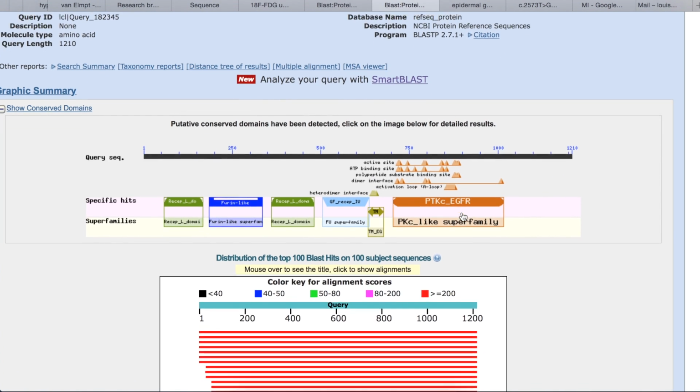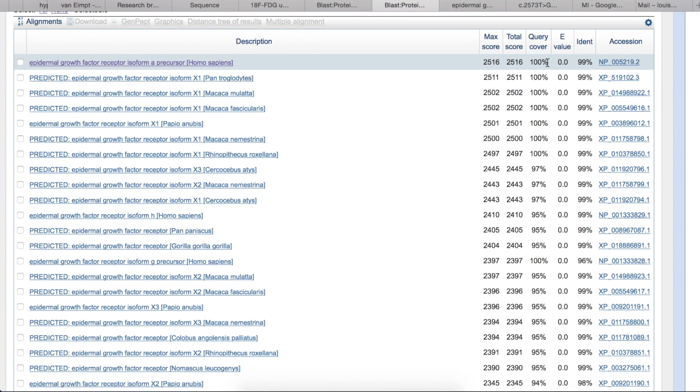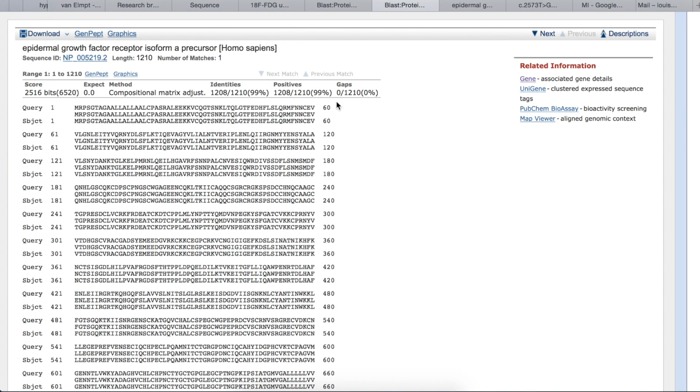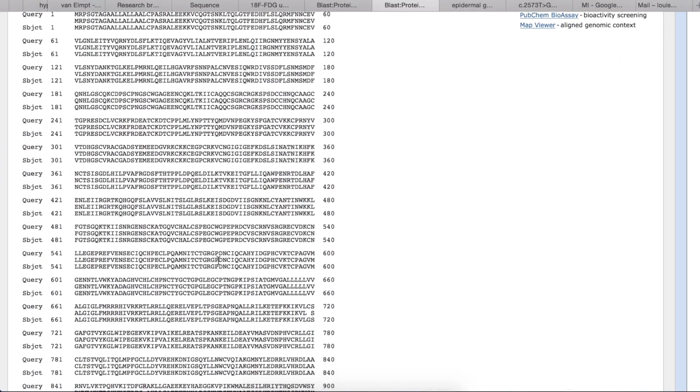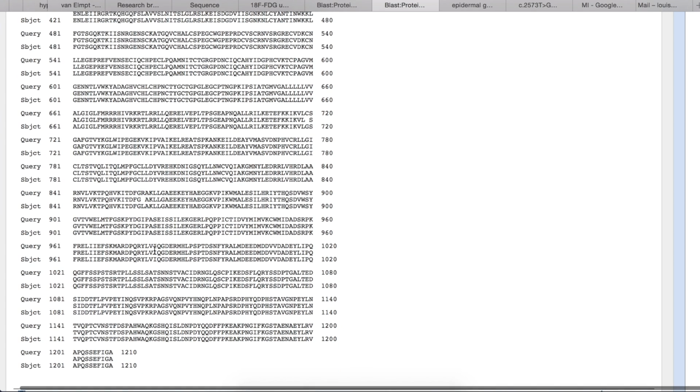Here shows the results of matches between the query sequence from the patient's relative and amino acid sequence in the database. There are many sequences with very high percentage of similarity to the query sequence. We are only interested in the Homo sapiens sequence with 99% similarity. The expectation value of 0 means that there is 0% chance that the alignment was due to chance, therefore they must be homologous. The exact comparison between each amino acid will be shown, with mismatched pairs represented as gaps.